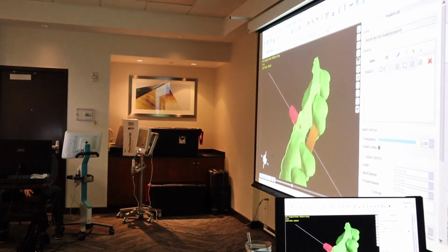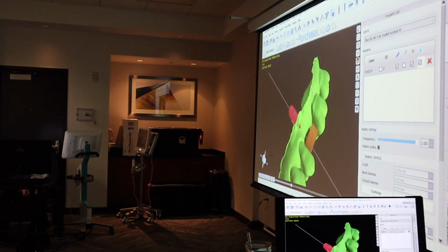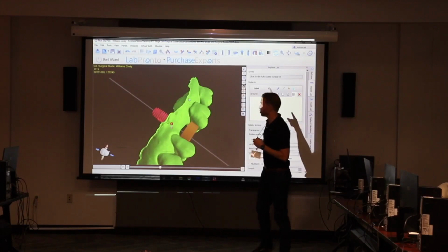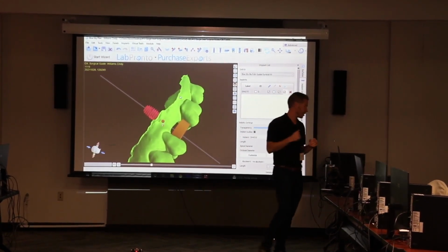So there's not a different kit. You're just selecting the pilot kit for the default settings, but you're using just your pilot drill. So if you're in the Blue Sky world, they have a recommended pilot drill, which is just a standard drill, like 2 millimeters, and the associated pilot sleeve. So you go on their website, and they've clarified that. Yeah, a metal sleeve just for that, and that's all calibrated. And if you chose that in the drill kit, it'll show you the part numbers to make sure that you're ordering the right ones when you do the report and stuff.